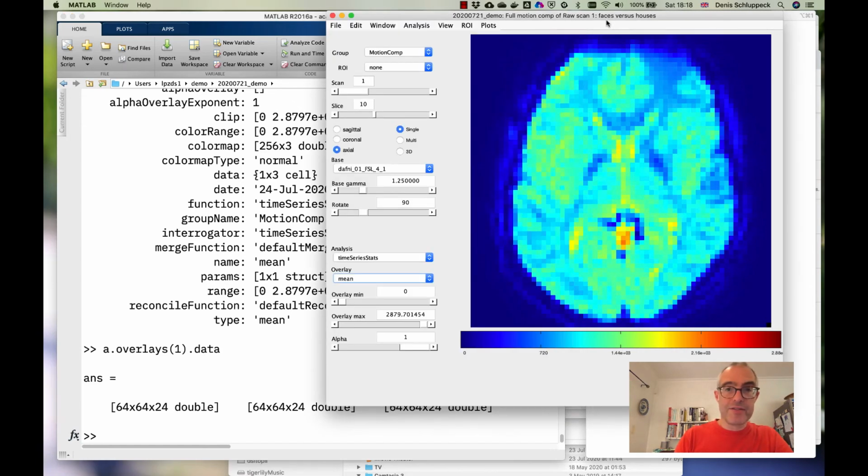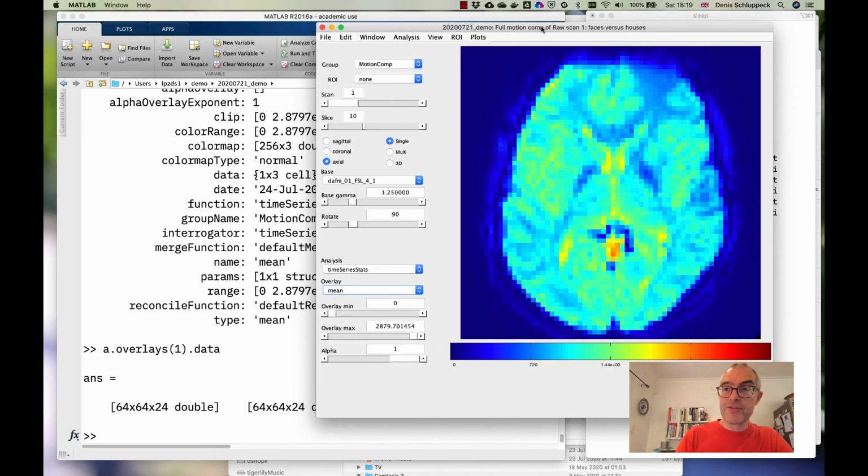Now I want to finish this short video. We'll do another one on some of the nitty-gritty, and I will show you at the end of this video a pointer to what to read up on to get much more detail, and some suggestions for how to do scripting. So one thing I want to point out to you now is a gotcha when you first get started with this.